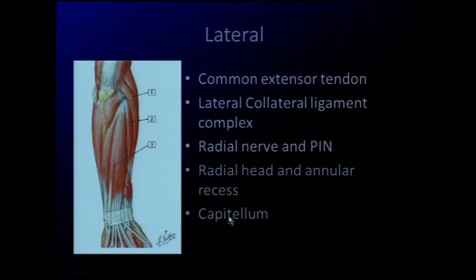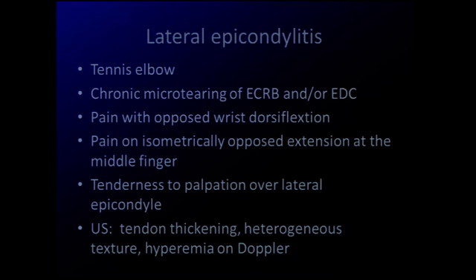And these are other lateral structures that I won't be covering for this lecture. So, lateral epicondylitis. Now that we've reviewed medial epicondylitis, it is the same appearance, but now involving the common extensor tendon as it inserts on the lateral epicondyle. This is also known as tennis elbow.